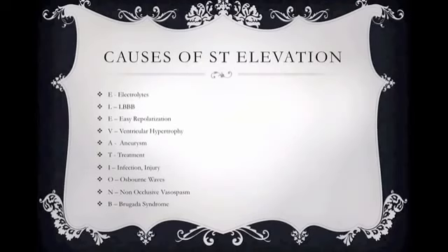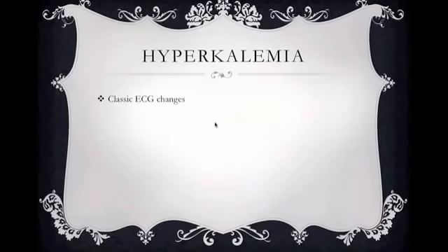We're not going to go too much into the treatment aspect of it, pericardiocentesis. All we're going to say about that is if you're doing a pericardiocentesis and notice ST segment elevation, it might be normal. We're not going to talk too much about non-occlusive vasospasm. That is our angina patients. If you see chest pain, ST segment elevation, well, that's going to kind of go hand in hand with our infarction. So getting on to it.